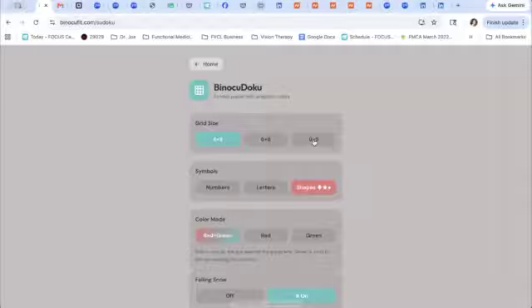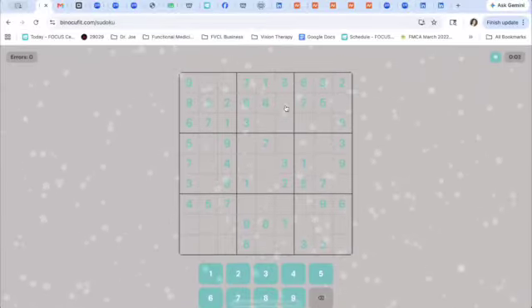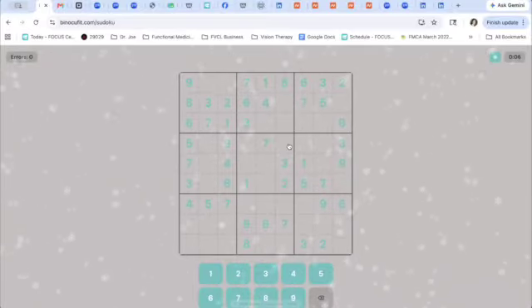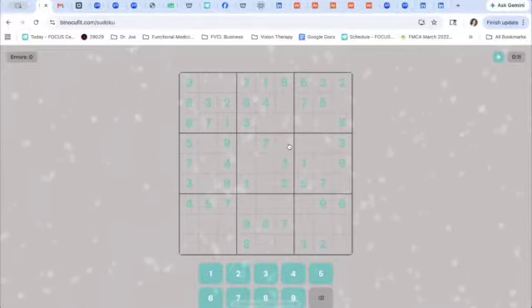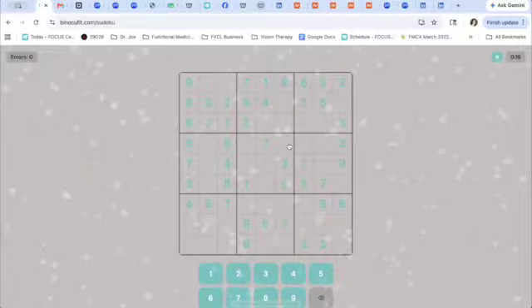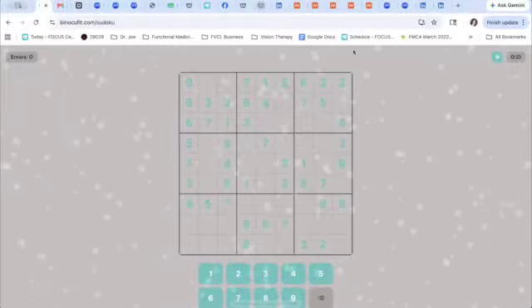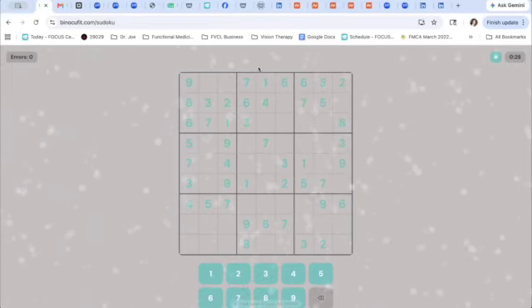You can do a traditional 9 by 9 with numbers. And again, you can make it trainable in the MFBF format. Depending on how long it takes somebody to do a Sudoku, this is definitely appropriate for a teenager or an adult. Just go and do a couple Sudoku puzzles a day as your practice, which has worked out for a couple of the teenagers that I'm working with that I've had a hard time motivating to do any bit of their homework or their activities. So it's been nice to have that.